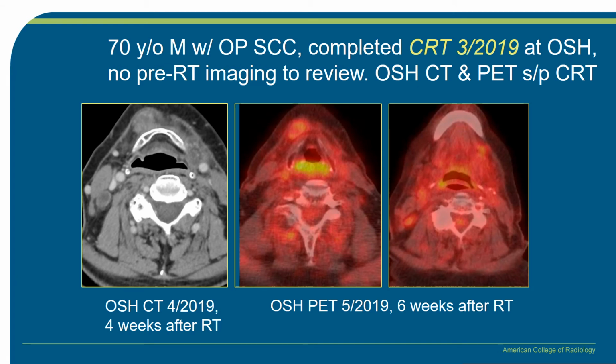What happens if you image patients too early after treatment? So this patient, after CRT for an oropharyngeal primary, got their CT at only 4 weeks. So yes, these nodes look very irregularly enhancing. If this was at 12 weeks, we would be giving this a NI-RADS 3. Here you can see some residual uptake in these nodes. But generally, if they're not in the right time frame, I will give it a NI-RADS 2 and ask them to bring the patient back in the right time frame.